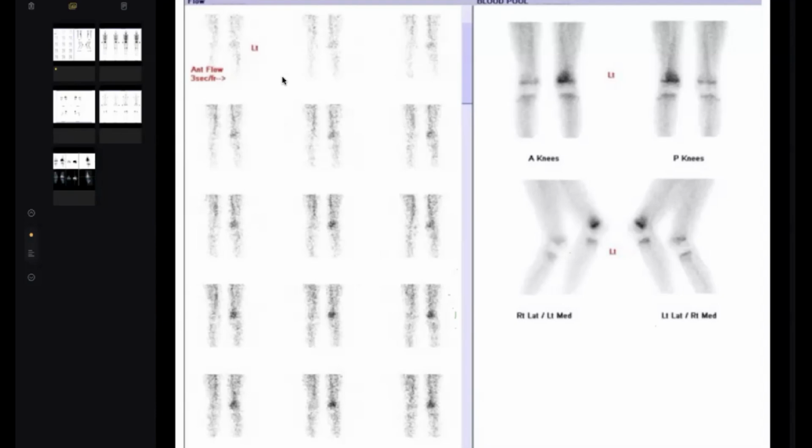Yes. And I want to correlate with plain radiograph, although a normal radiograph will not exclude osteomyelitis, as the nuclear changes will precede X-ray changes by about 2 weeks. I want to correlate with the blood tests also, inflammatory markers, to confirm my finding of left side acute osteomyelitis. Okay, so conclude.